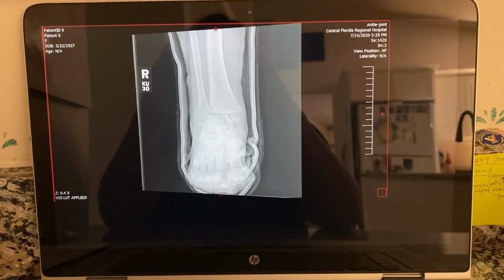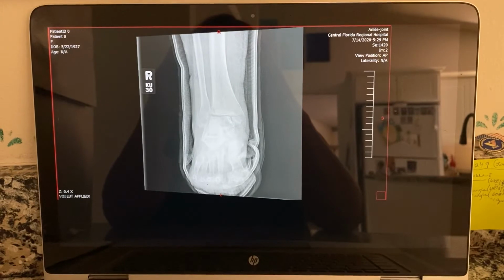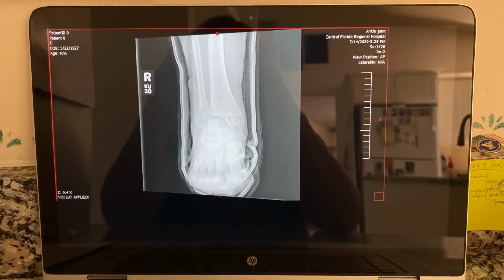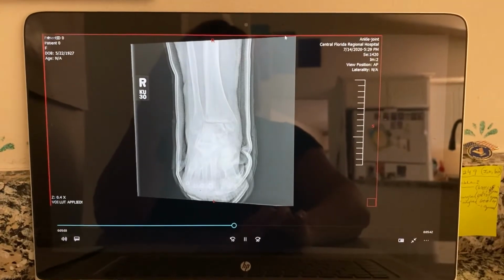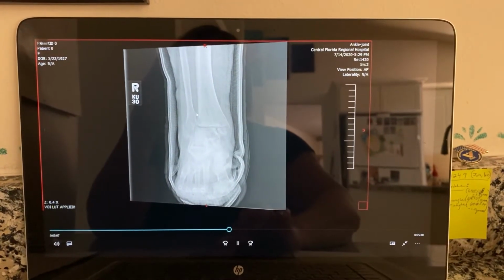The patient was positioned supine with her leg extended, rolled to her left with a wedge positioning sponge placed near her right hip. Collimation is present to the lateral margins of the ankle to include the distal tibia and fibula and proximal half of the metatarsals.